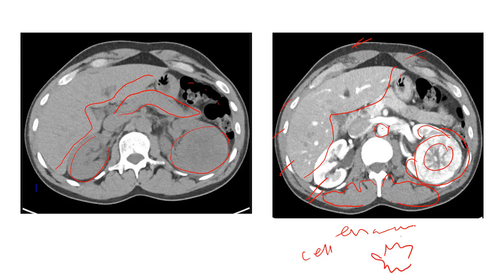So this central stellate scar is very pathognomonic of oncocytoma, usually present in nearly 30% of cases, which helps with distinguishing from RCC. So till now we know that our lesion does not have a central stellate scar, so it was not an oncocytoma.